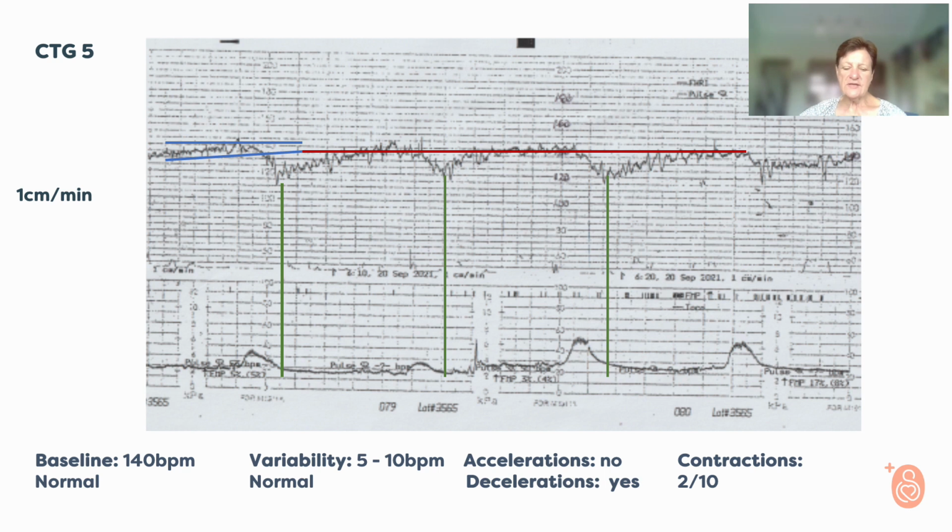And with every single contraction on this little part of the CTG, there is a deceleration. With every contraction, there is a deceleration.